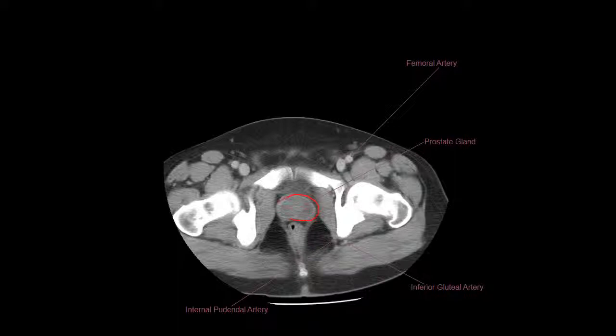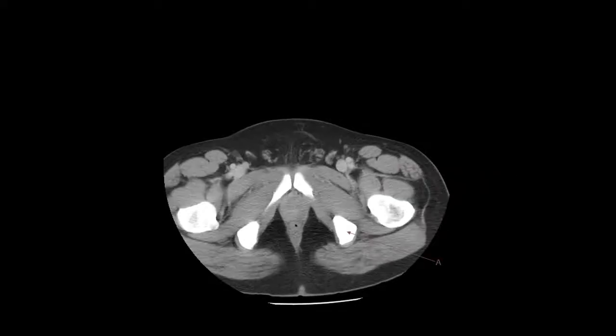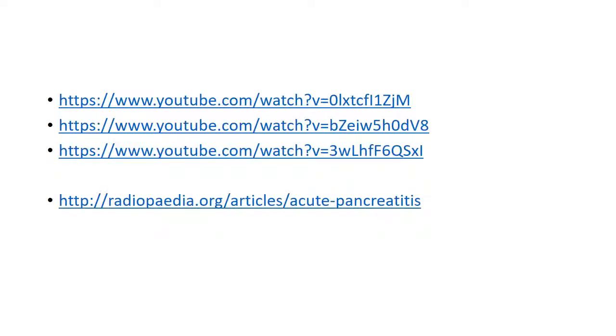So it's below the bladder, as you noted. And then that's the prostate. It's that walnut-shaped structure. It does have the two lobes posteriorly that you're feeling on exam when you do the rectal exam. There's a rectum. Okay. Rectus femoris, ischium, and that's it.